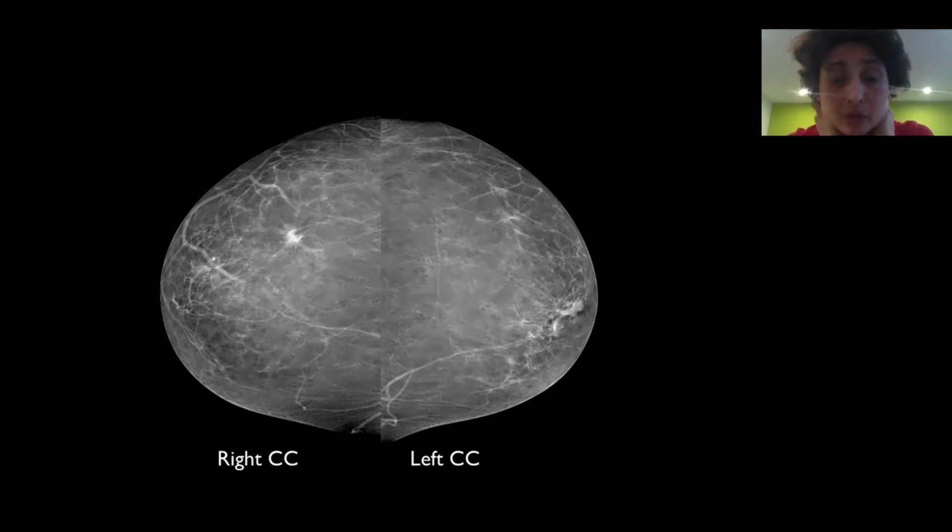So to summarize always: bilateral screening mammograms, fatty breasts showing a spiculate lesion in the outer right breast and a small indeterminate area in the inner half of the left breast, for which the patient will be recalled to an assessment radiology clinic and investigated with further views of the mammogram, which could be compression views or something called digital breast tomosynthesis, which I shall show you in a minute, and also ultrasound and a biopsy will be performed.